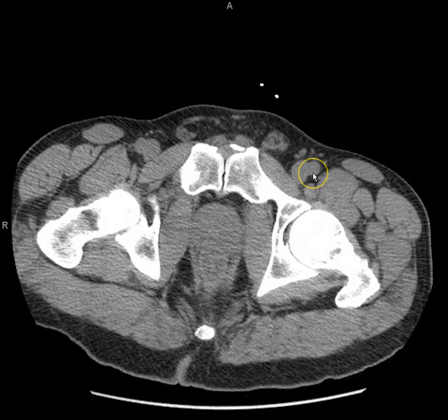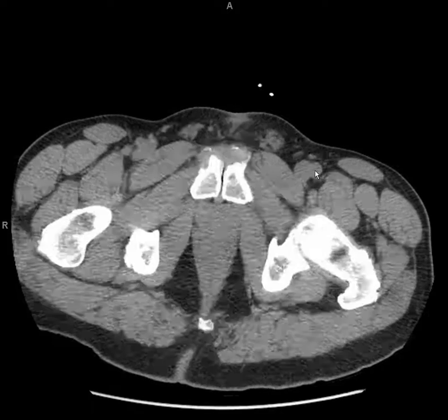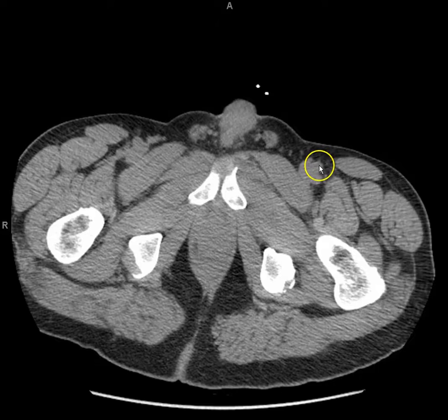Common femoral artery, right? And then you go a little further, and that's as far as it goes, but you can see it split here and here. It's trying to split up. So this is the bifurcation of the common femoral into the deep and superficial femoral, the superficial femoral and profunda femoris.